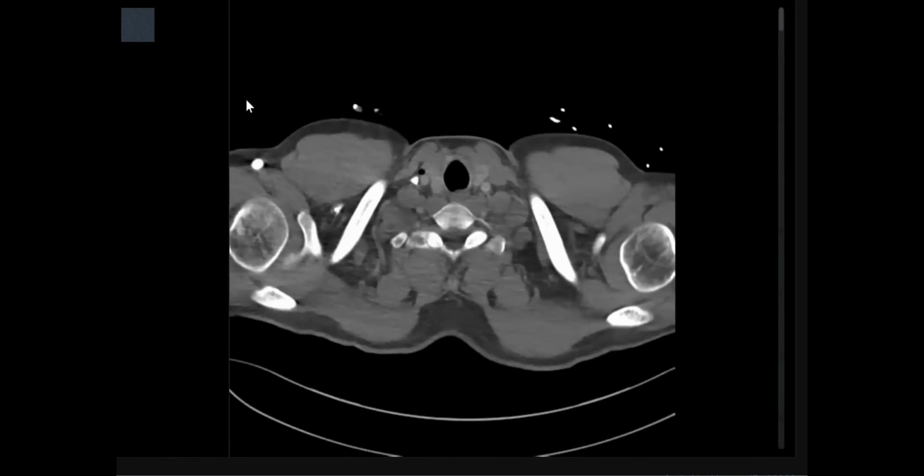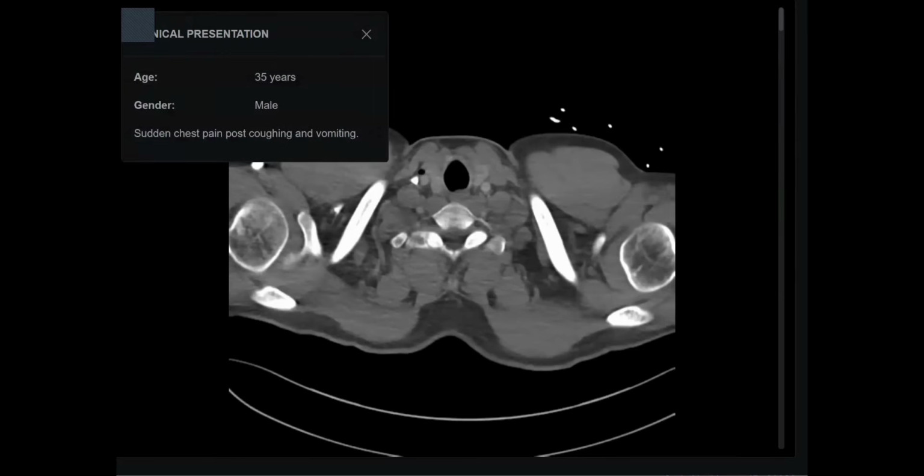If it is hemoptysis, I would be concerned that this patient is congested. I'm sorry, hematemesis. If there is hematemesis, then I would be concerned about a few points. First, is this pleural effusion coming from esophageal bleeding varices? Also, I would scrutinize the mediastinum to see if there is any pneumomediastinum.